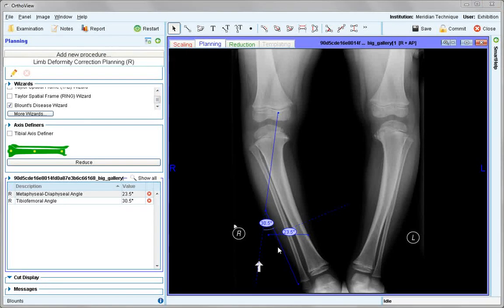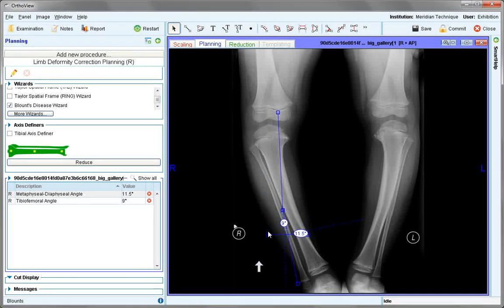Firstly, two connected lines in a roughly vertical position and one horizontal line. The two vertical lines are designed to measure the femorotibial angle. Place along the shaft axes as appropriate. However, if you use the tibial section and the horizontal line in conjunction, measure the metaphyseal diaphyseal angle.